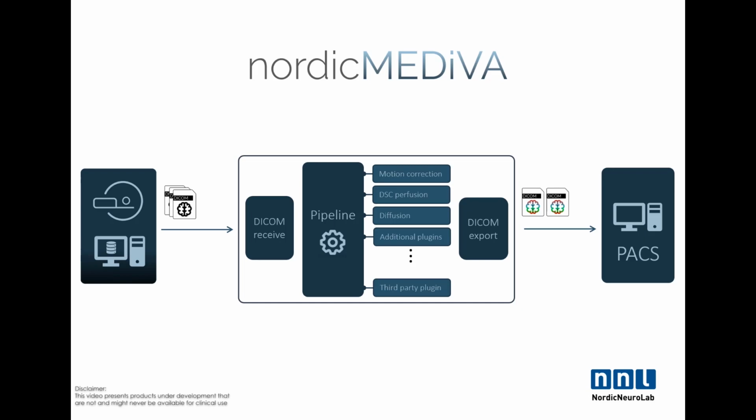Each plugin has specific analysis settings, which can be specified by the user. After the analysis is done, a DICOM exporter prepares the output maps and sends them to a remote DICOM entity that is specified.